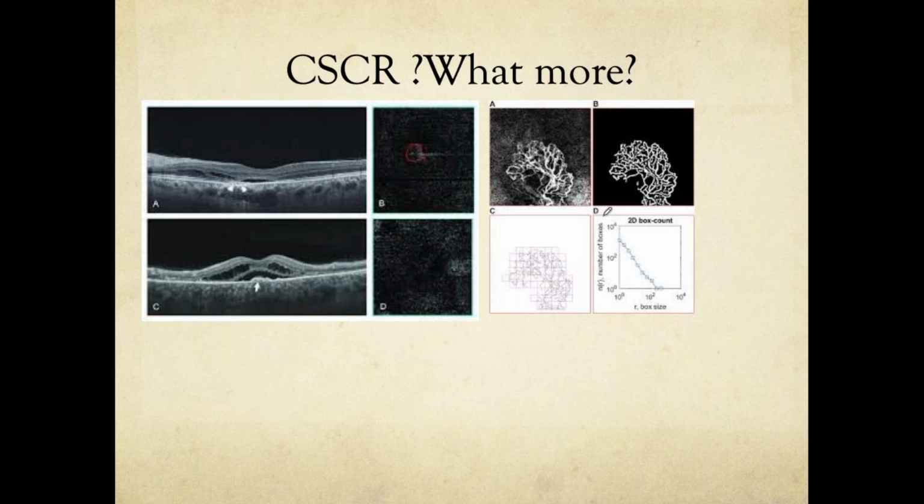So just a little bit of the OCT findings, and this is an OCTA, which is also known as the OCT angiogram. Somebody asked me what OCT I use in my practice. I use the Topcon Triton DRI. It's an OCT angiography with deep range imaging.